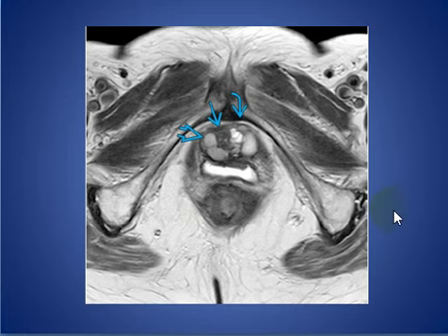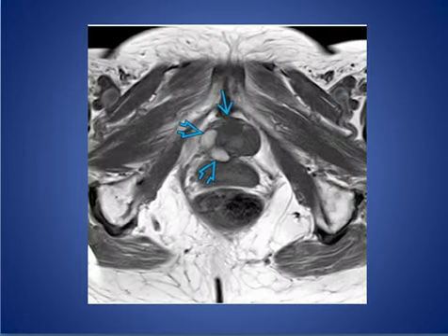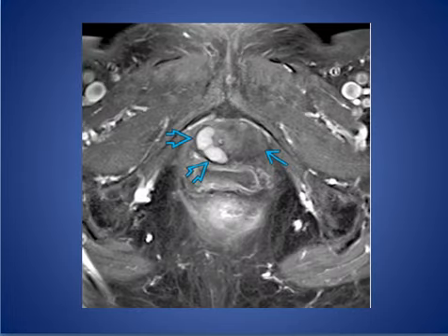It is the same patient with T2 weighted images, and some of the cysts are high signal intensity, likely due to hemorrhage. And in a patient with endocervicosis on this axial T1 weighted image, clusters of cysts around the urethra, and some cysts have high signal intensity, likely due to hemorrhage. This is the endocervicosis, axial T1 after contrast. It shows a cluster of urethral cysts here with high signal intensity due to hemorrhage, and there is no enhancement after contrast injection.